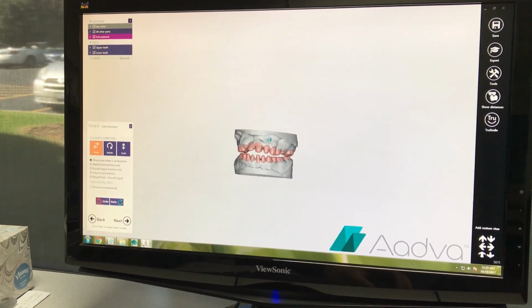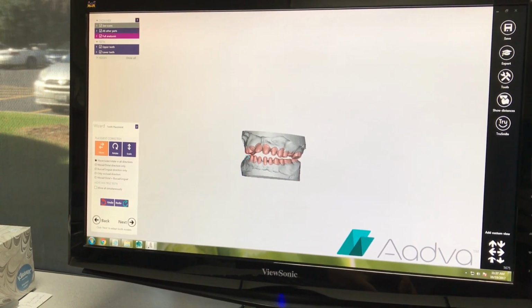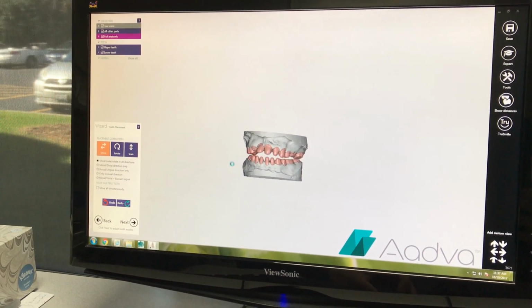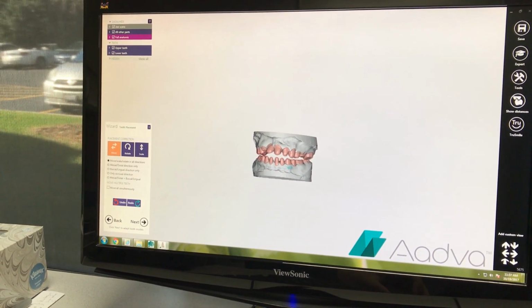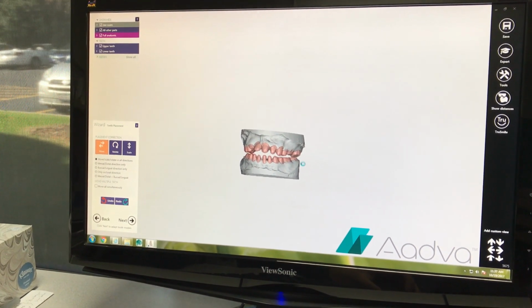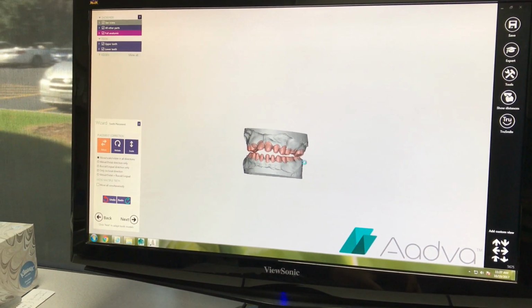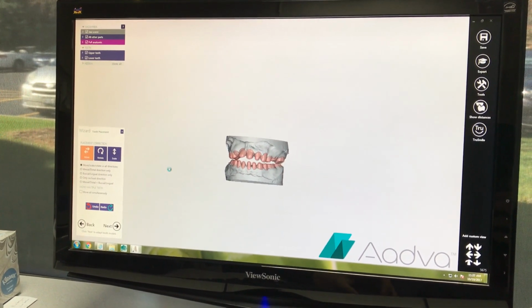Okay, so these are the crown bottoms that are being generated, and it's all of the margins that Nora previously did. So she did them all already, and we're just showing you how to redo the margins, walking you through exo, and it has to charge up a little bit. We got lots of information here.